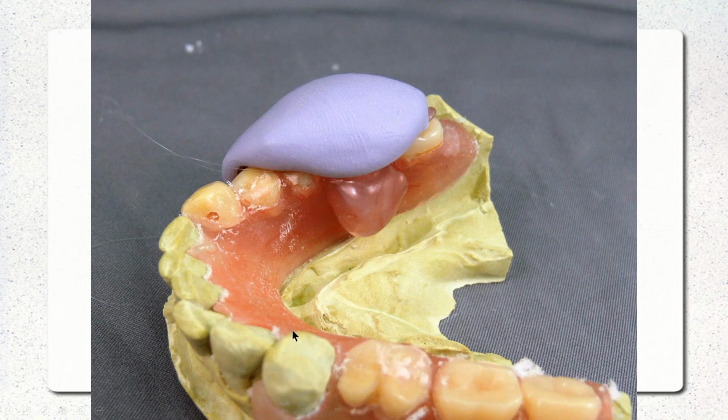Material will ooze out. A lot of times I'll take a piece of tin foil wrapped on my finger, wearing a pair of protective gloves, and I'll just smush that blob back in. Every once in a while you'll get a bubble here if you don't do that. And sometimes it finishes off, and sometimes you have to do a second little repair for that. So if you smush it, it takes that possibility away.